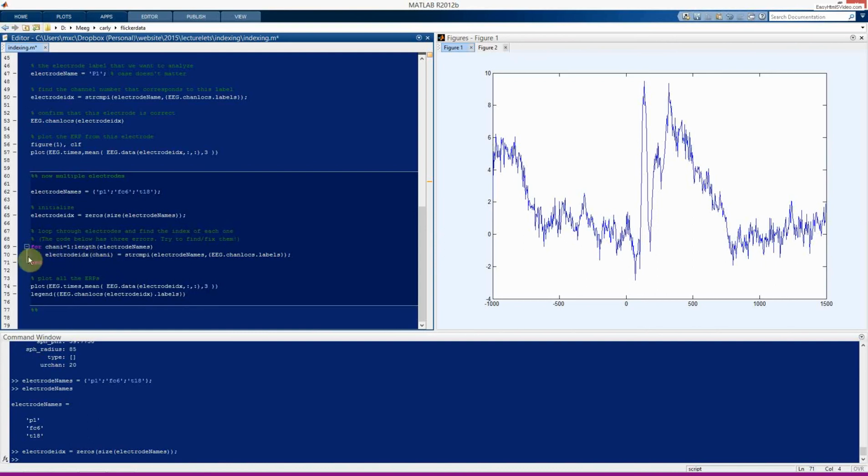So when I have a loop that I'm not sure if it works, or if I just wrote a loop for the first time, what I like to do is not run the entire loop, but instead run through the loop one line at a time to see what everything does and make sure that everything works. So this is, of course, a very simple case where the entire loop is only one line, but very often you'll see larger loops with tens or maybe even hundreds of lines of code. Okay, so we are going to just assign this looping index variable to 1.